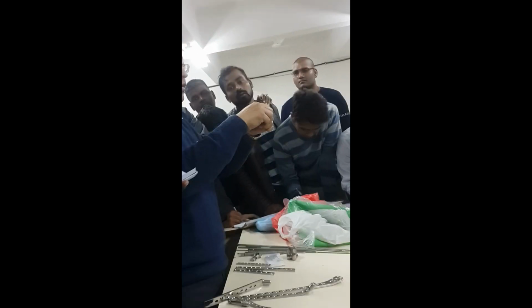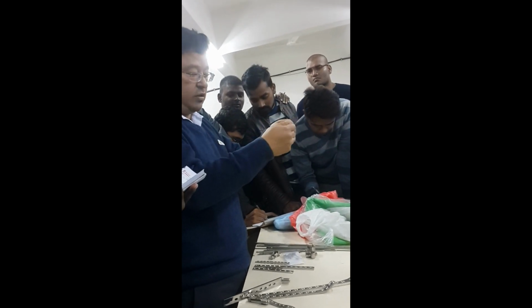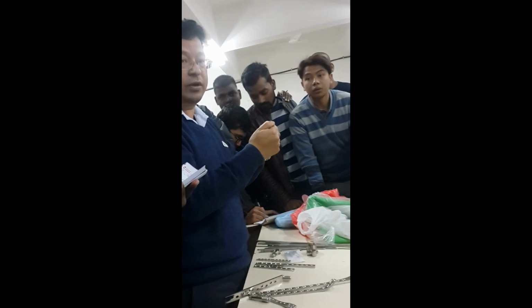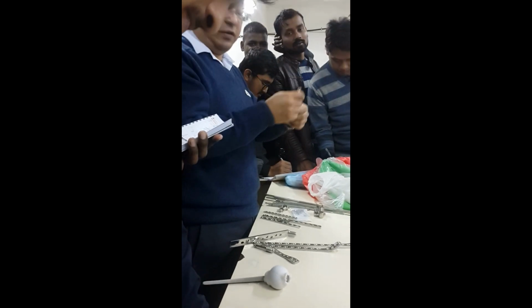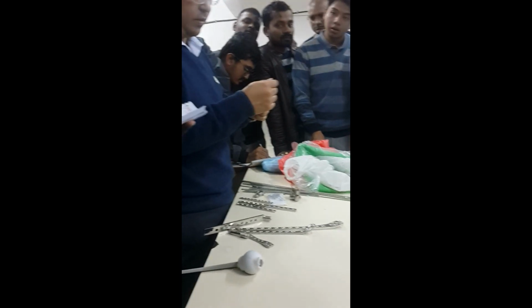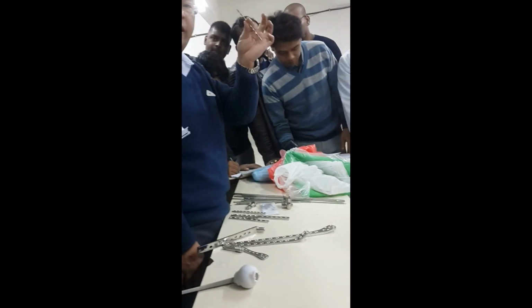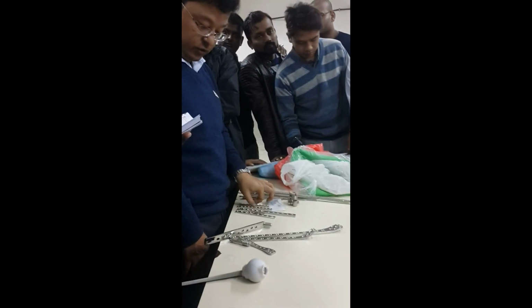Doing it by hand is a bit difficult, and tight bends will be hard, so we need forceps or a bender. It is mainly for the clavicle and pelvis. For the pelvis, the surface is curved, so if you want to apply it on this curve, you have to bend it like this and apply on this. So reconstruction plates are used for the clavicle, pelvis, and even the fibula can be applied. For fibula, both 1/3 tubular and recon.